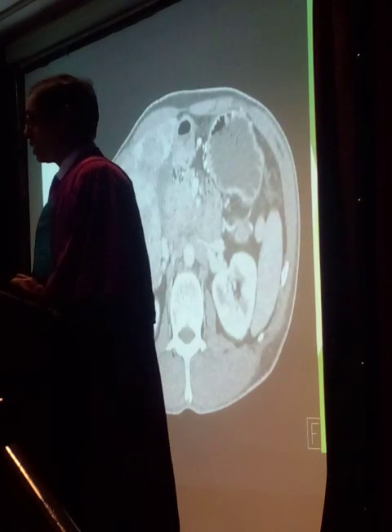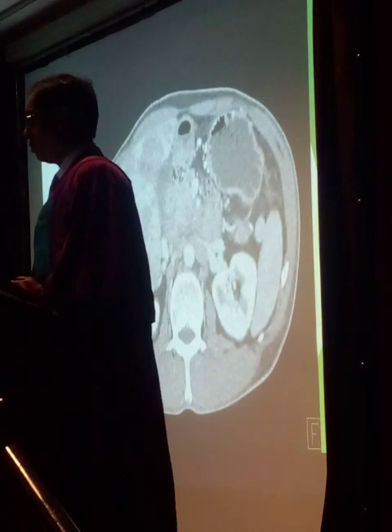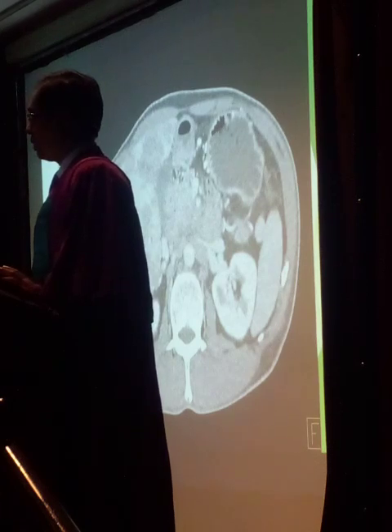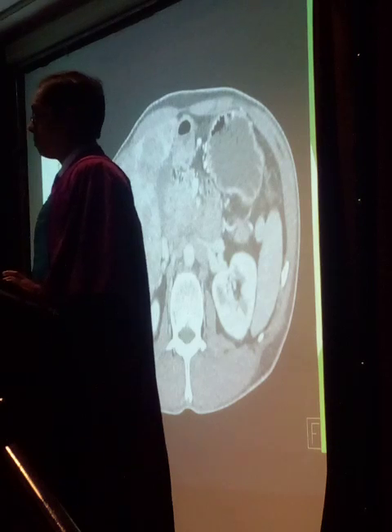So this is another example. Even we can't see the primary pathology because of edema and tissue change because of the primary carcinoma, we can see multiple liver metastases. So we are always suspecting pancreatic carcinoma in this background.